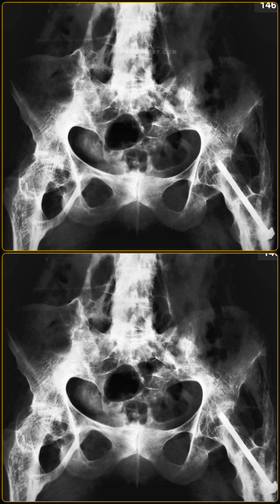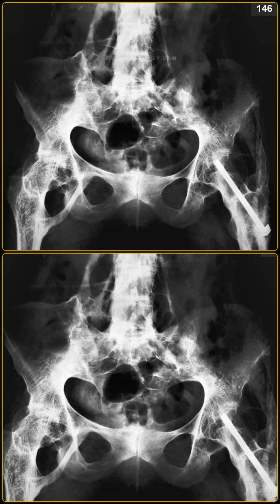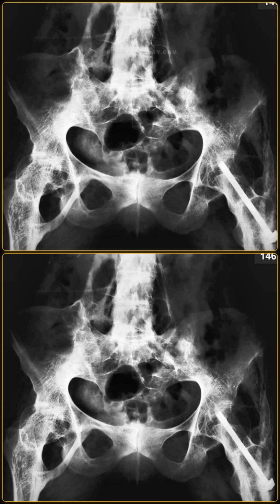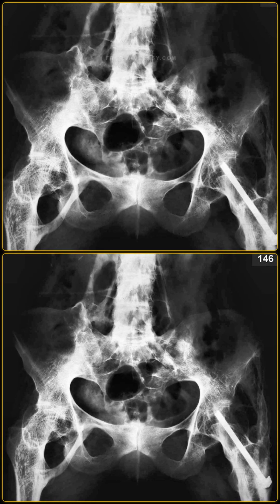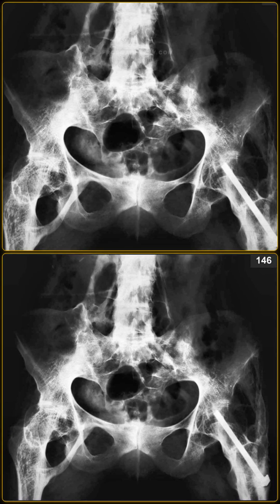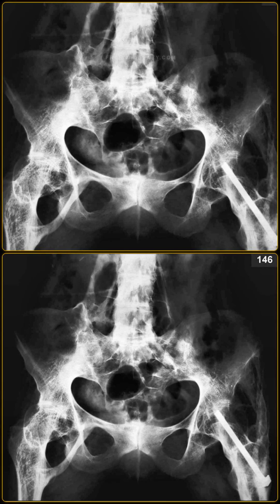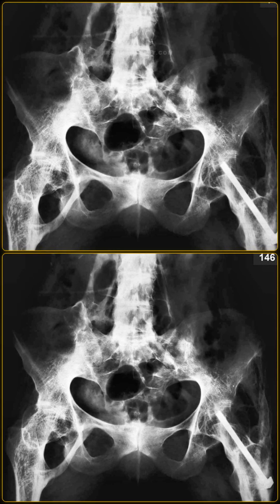What is the significance of the previous surgical hardware visible on this patient's radiograph? The surgical hardware reflects a historical attempt to surgically release hip joint stiffness or treat a pathological fracture. However, surgical trauma, intramuscular injections, or biopsies are strictly contraindicated in these patients.